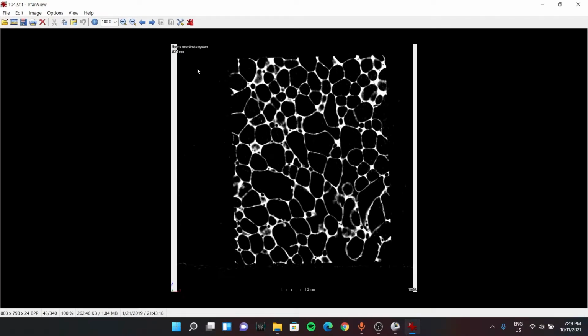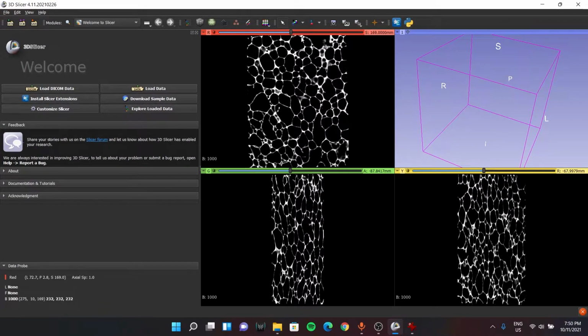So there's a constant length change. So that length is 0.06 mm. So we got one axis length, so now we need to give that particular value to these coordinates.